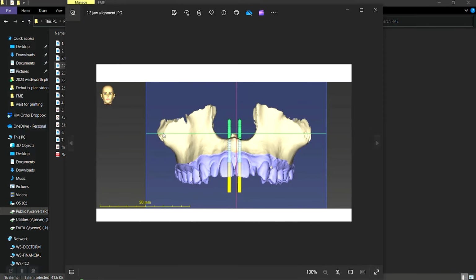You can see this is taken all the way up to the base of the zygoma here. So there's a lot of different angles. This is taken from the skeleton as well. So you can see where the facial midline is compared to these lines. They have significance, right? That's correct. These axes that we're seeing? That's correct. I don't get it, really. I know they're trying to plot something, but what are those lines telling us?